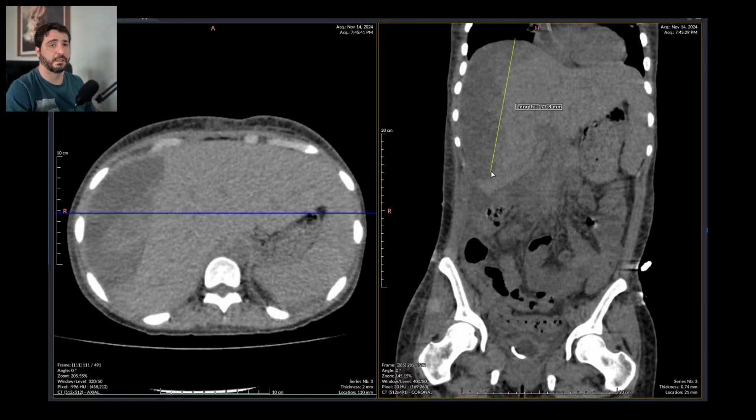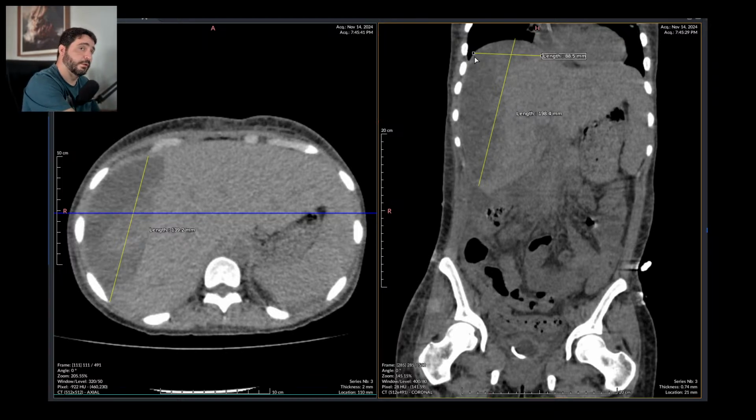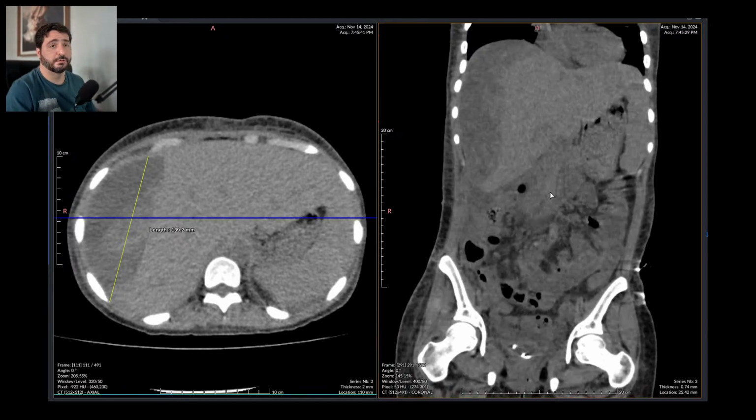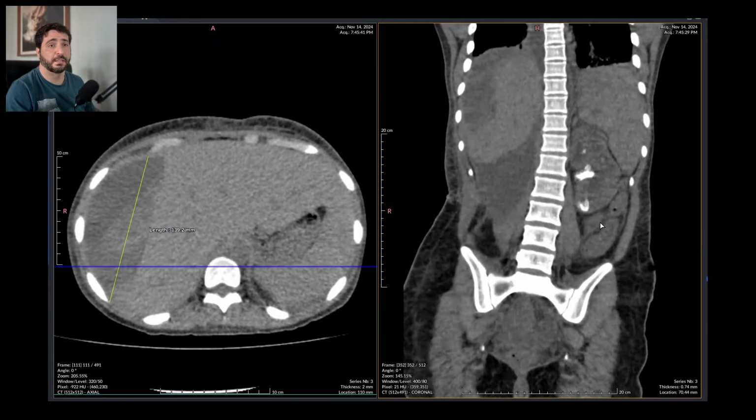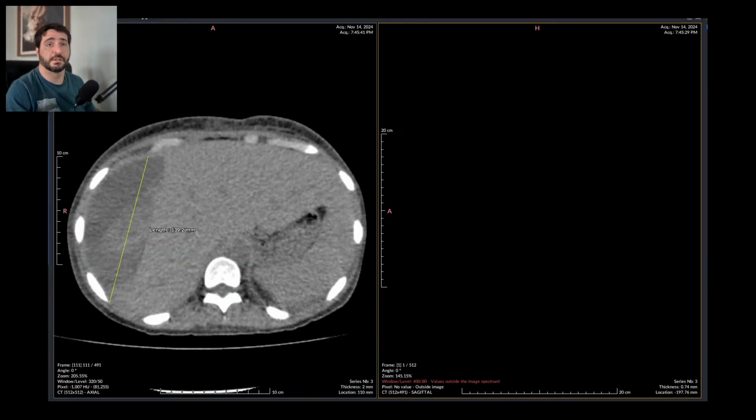This is just way too serious. And it's really common in this kind of state-run hospitals in Brazil. Unfortunately, they just leave the patients to their own luck for days until they order this kind of crappy scans, and they do nothing, just wait for the patient to die in misery.